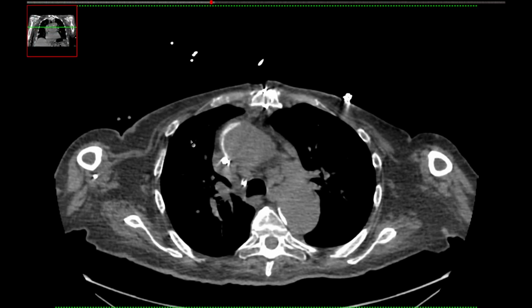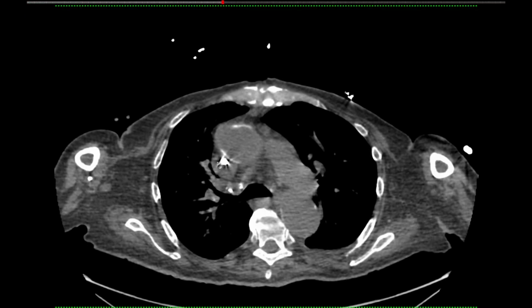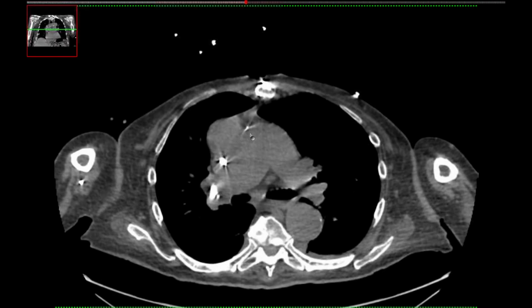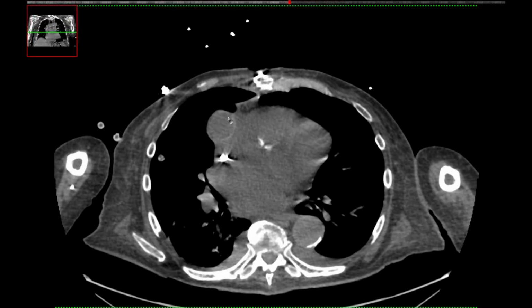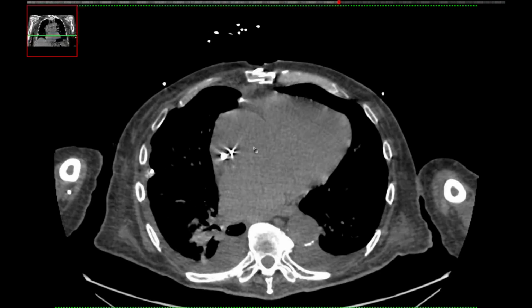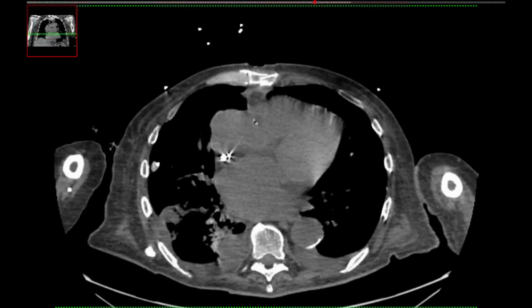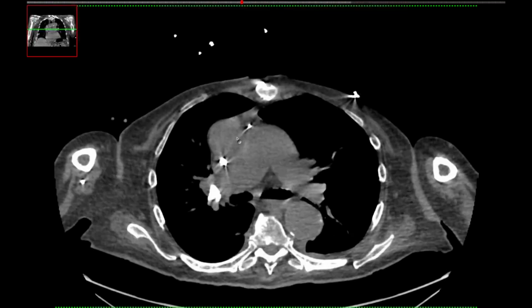You can see he's got a renal dialysis catheter. At the time of the surgery, they resected his ascending aorta because there was a dissection flap. So this is a distal anastomosis. So this is a graft. They used the hemishield, I presume that's like a Dacron graft. Then you can see it distally, and then the donor root is still there, and it all looked fine at this time from a transplant standpoint. They were most interested in his lungs for the CT.